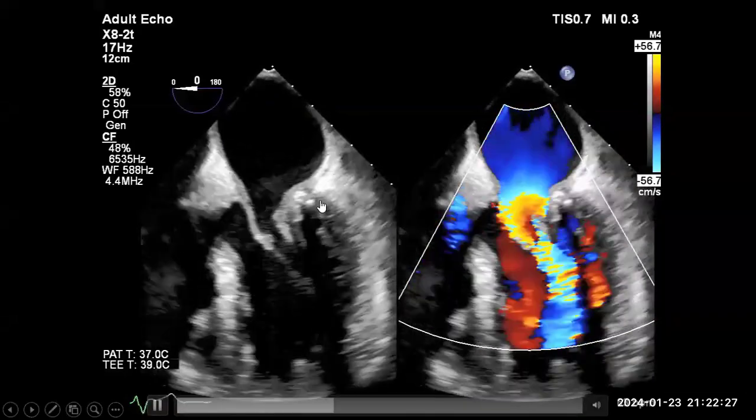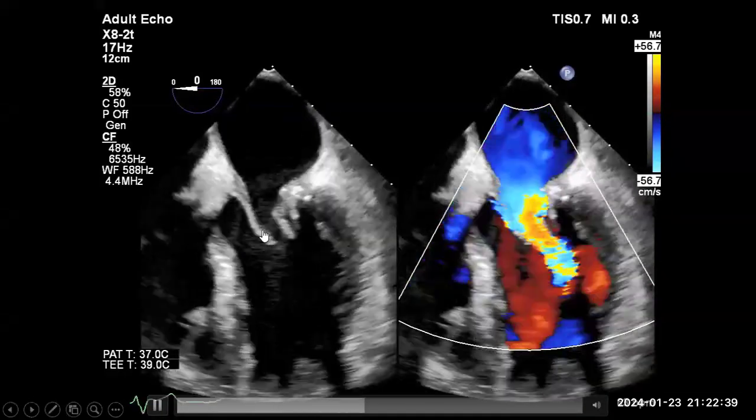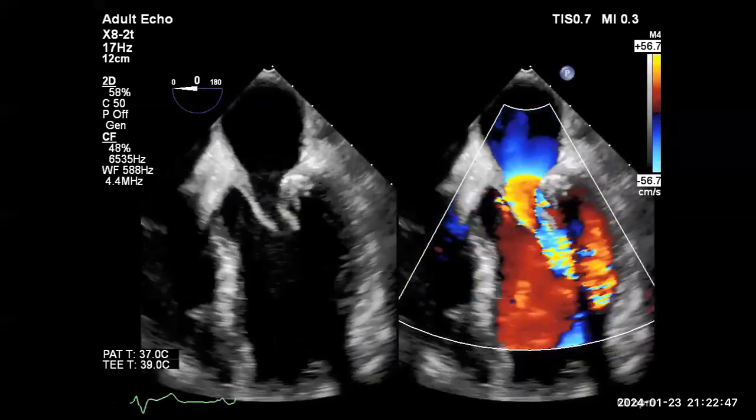So did you notice that? It's not a ruptured chorda. So any other, or should I comment? There's a thickening of the leaflet and destruction. It could be a vegetation. Yes, this is exactly what I needed to hear.